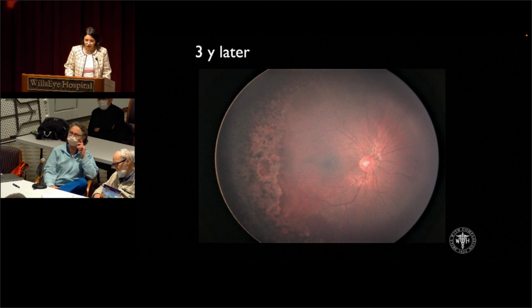Okay, so we did the laser, and these are the images after 3 years.